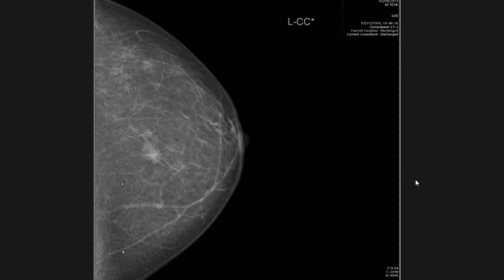It's just to note there is some calcification in this breast tissue, but it's benign. It looks as though it's dermal calcification, so that can be ignored. You wouldn't get penalised in the exam for not mentioning that. But well done. Thank you.